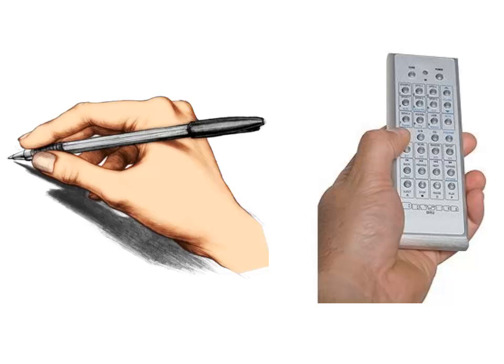Now for the transducer hold. The two standard transducer holds are the pencil hold and the remote control hold. You will need to switch back and forth between these two hold methods while scanning. The advantage of the pencil hold is that you will have a lot of freedom to manipulate the transducer in space and to change its angle, tilt, and rotation.